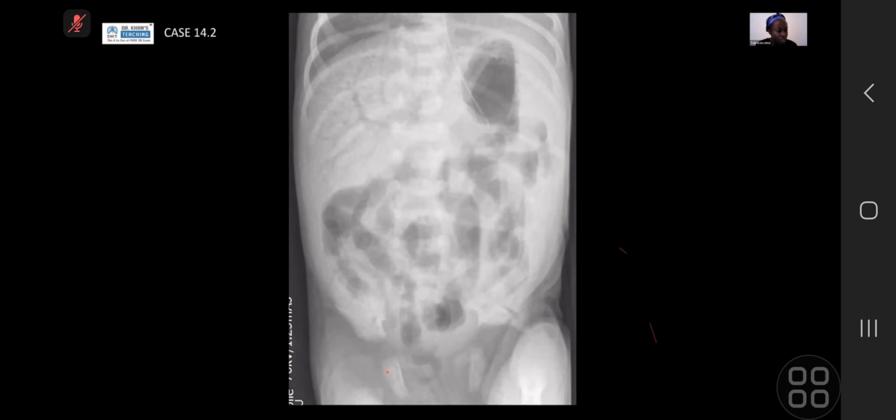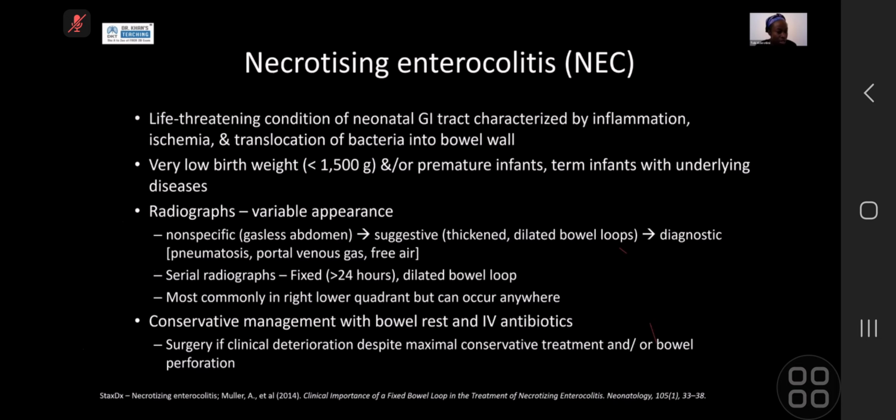If the patient had a UVC, umbilical venous catheter in, and I saw it was misplaced, like we saw in an earlier case where it was in the liver, and I saw portal venous gas, then I would more likely put that down to the misplaced UVC rather than necrotizing enterocolitis. But it's an important point to have as a differential when you see portal venous gas. Is there a misplaced umbilical venous catheter? And then we can potentially see some areas of pneumatosis, although it's not super florid on this radiograph. And the other thing we're looking for is perforation, so any evidence of pneumoperitoneum, because these children are at risk of perforating with necrotizing enterocolitis.